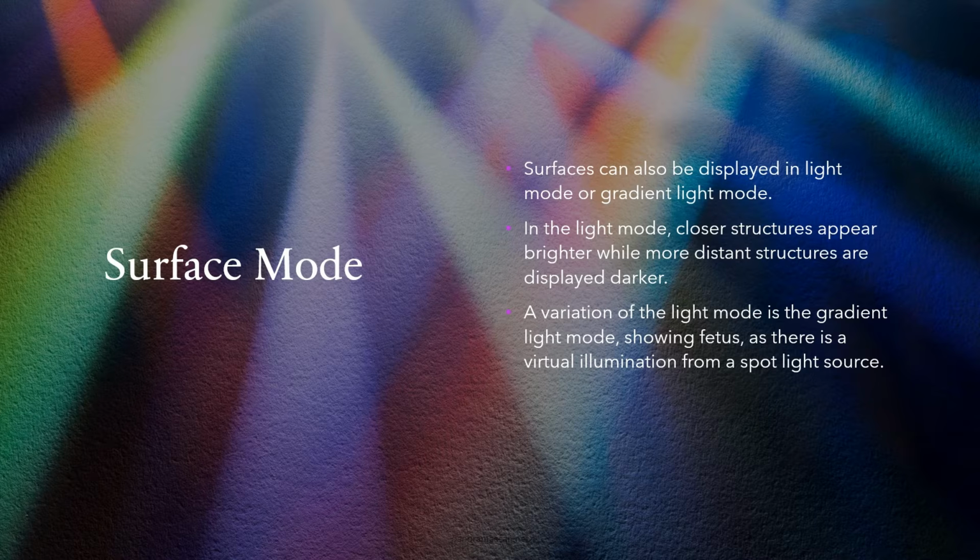By adjusting the threshold, selecting the textural or smooth surface display, and utilizing the light and gradient light modes, clinicians can enhance the surface rendering to create the most accurate, detailed, and diagnostic images possible.